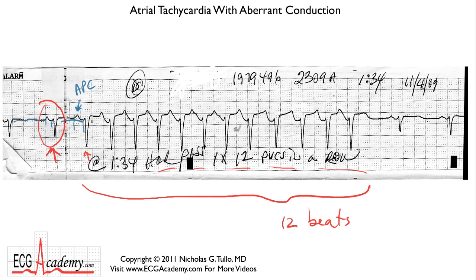Well, what comes after that? You have another QRS complex, which looks exactly the same as this one, and there does appear to be a P wave in front of it. If you look at the PR interval, it's even gotten slightly longer. And if you scan across, I think it's easy to see that there are P's marching through, each one superimposed on the previous T wave.